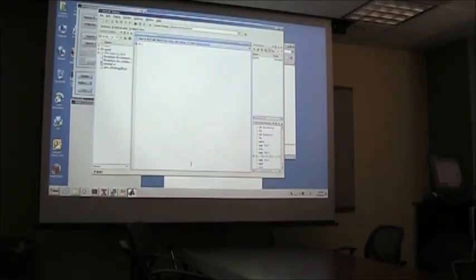Yes. I didn't realize that. So that's cool. Then I don't need the other one. And I'll do pre-processing for that? Not if this is raw data. So how do you pre-process this one file? You do the same thing.